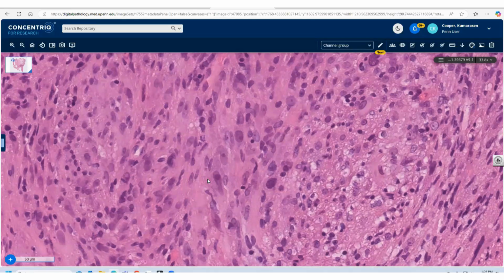it's less likely a metastasis given his age, but I was thinking, like in some of the other areas that you showed, I don't know if I'd do a histiocytic marker maybe, and maybe a vascular marker. Okay, that's a great start. Anybody else have any other contributions or thoughts to add to that, to broaden that differential diagnosis?